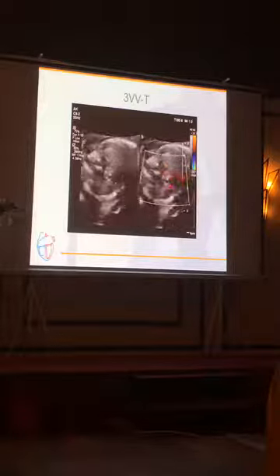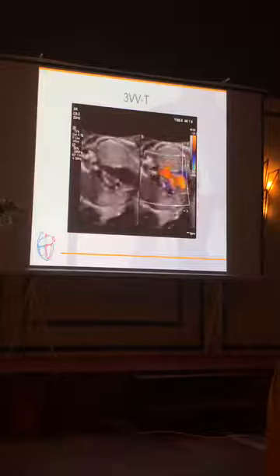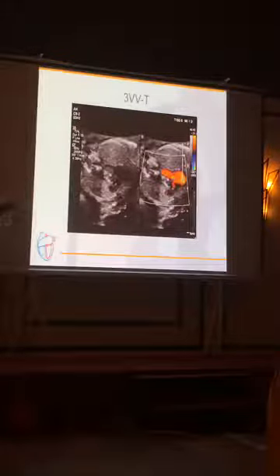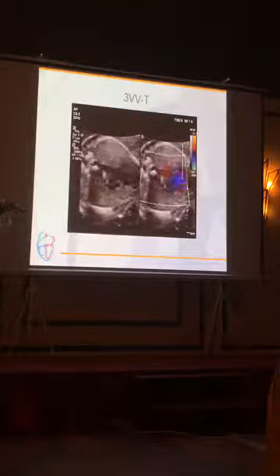So, as you can see, part of this aorta is missing. It ends with this circle, and it doesn't continue. So you suspect instantly that something is wrong with the aortic arch. And what are your options?